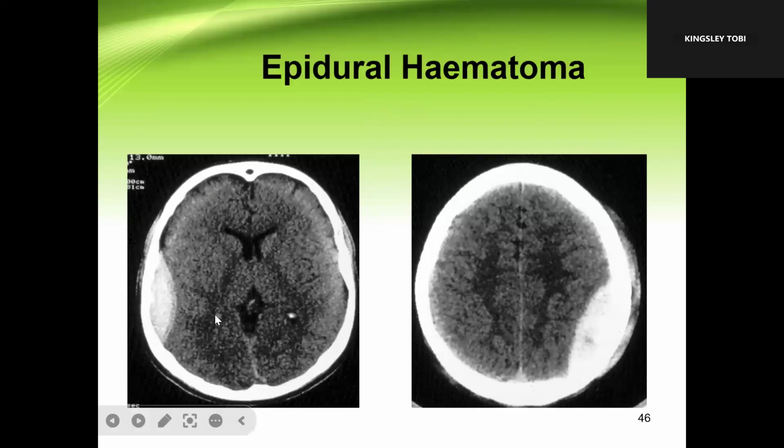All right, so this is another epidural hematoma on this side, epidural hematoma on this side, okay? It's bleeding between the skull bone and the dura mater.